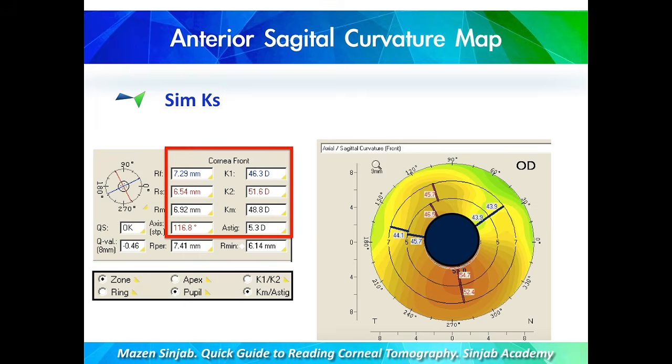The same thing can be said when we capture the patient under incorrect circumstances of illumination. We must capture the cornea under mesopic circumstances of illumination in order to have as much real as possible of the center of the pupil. Otherwise, the SIMKs presented will be incorrect.